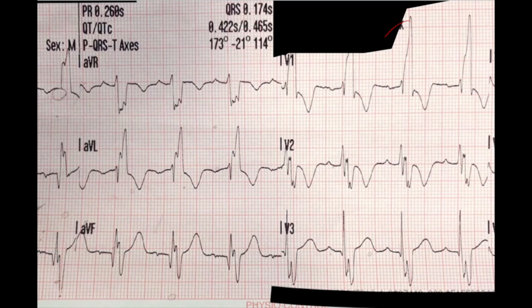we know that the P wave should be negative, but it seems to be positive, if not a little biphasic here. Again, we have this RS complex, and it seems like this S wave is fragmented or even slurred. And the T waves are fine because we know the T wave should be inverted.